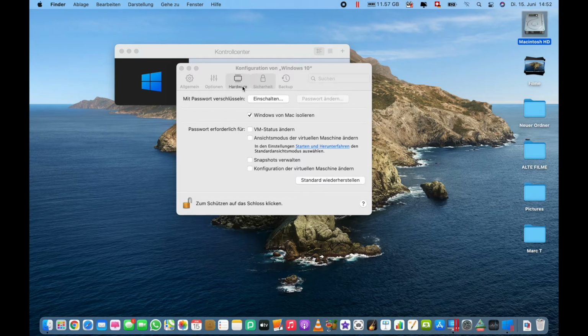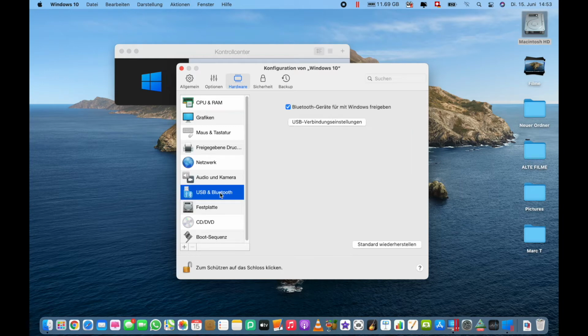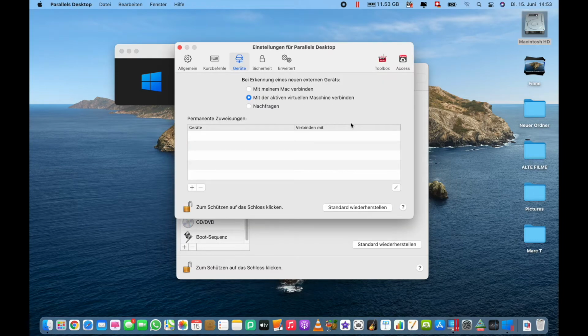One last thing you want to do is when you install the USB receiver to your Mac, and you can do this by an adapter between USB 3 and USB-C, works absolutely wonderful. What you then need to do is, instead of always having to disconnect and connect the USB driver at every new acquisition, go to USB Bluetooth settings, go to USB connection settings, and when you have the USB receiver connected, you can press on the plus.